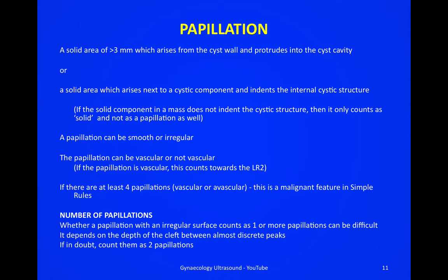Number of papillations can be difficult, and whether a papillation with an irregular surface counts as one or more papillations can be difficult. It depends on the depth of the cleft between almost discrete peaks. If in doubt, count them as 2 papillations.